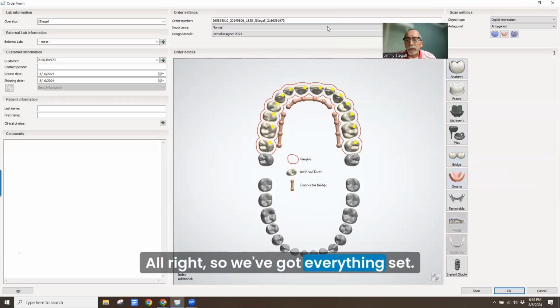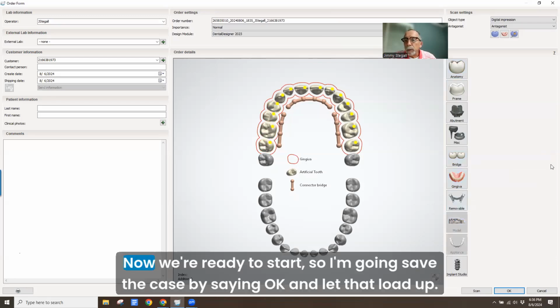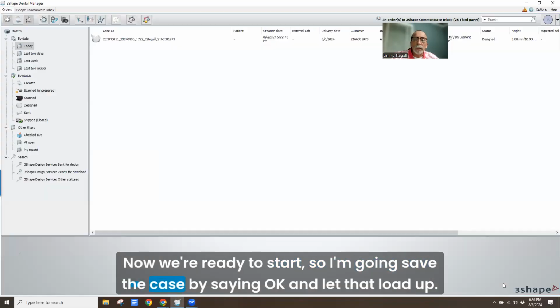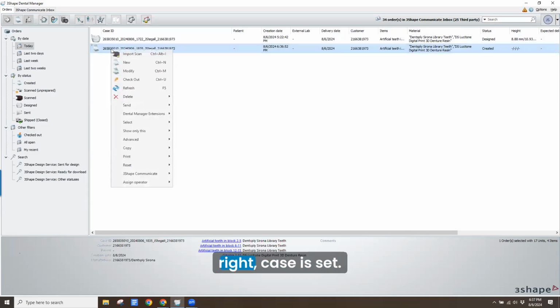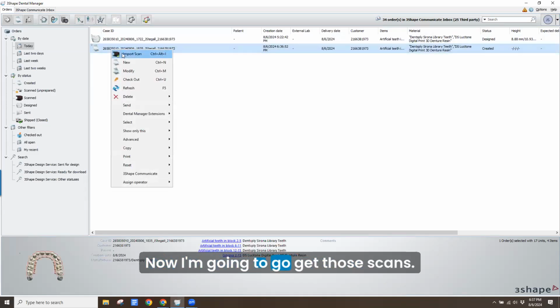All right, so we've got everything set. Now we're ready to start. So I'm going to save the case by saying okay, and let that load up, let the lock go away, and we'll be ready to start. All right, case is set. Now I'm going to go get those scans.